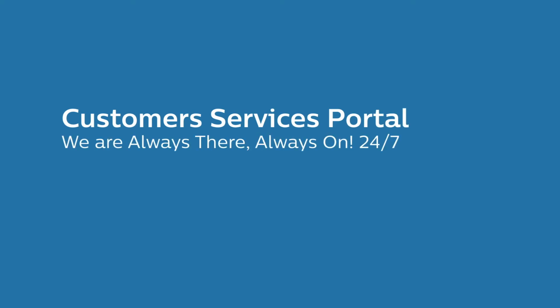With the Customer Services portal, we are always there, always on, 24/7.